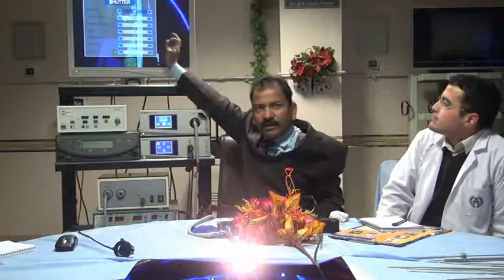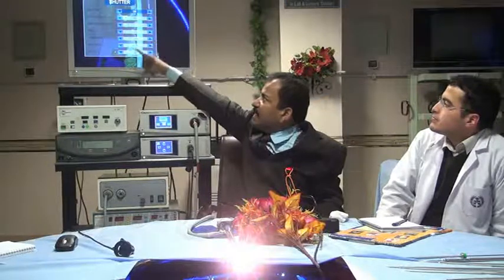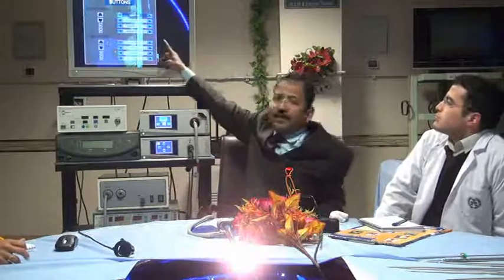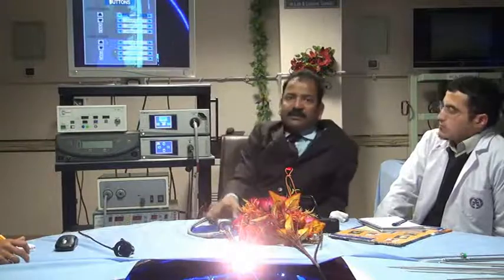Each and every fraction of the quality of the image, shutter, edges, brightness peak, size, target area, brightness control and brightness level, you can adjust. Exactly the same way you have the buttons. All the buttons are programmable. You can program each and every button. Every button has two functions. One is short press, another is long press.